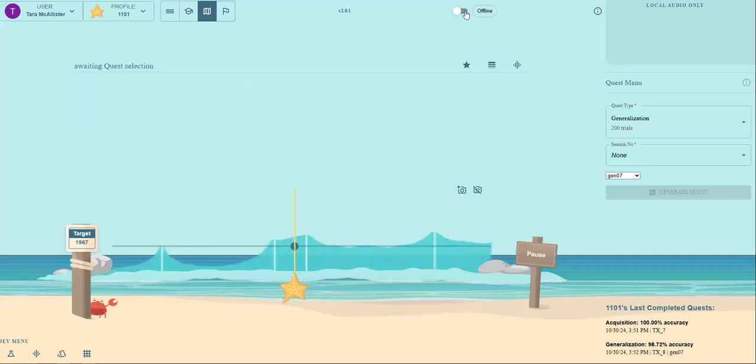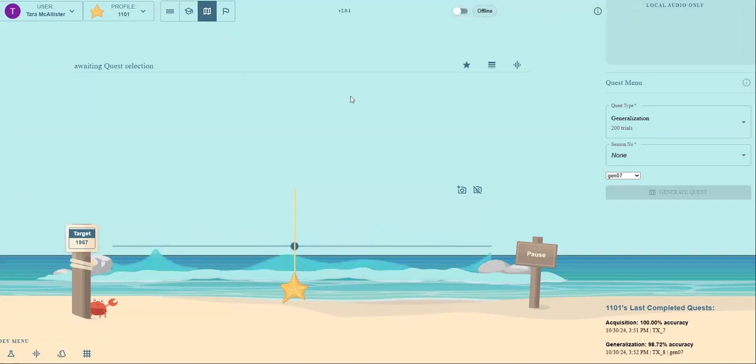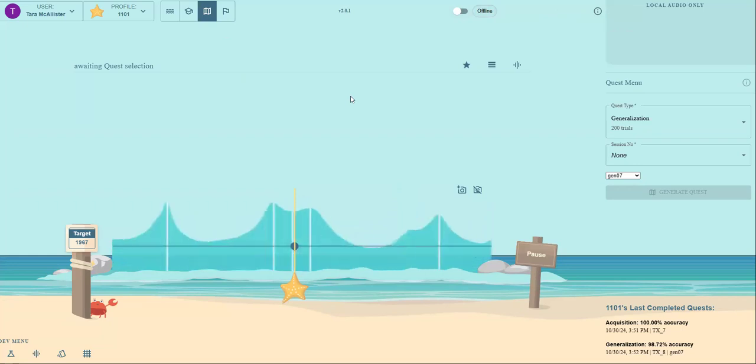One last feature supports remote treatment sessions via telepractice. When I click this toggle, it generates a private room using the Vonage Video API. The client and I can meet in this room where we'll hear each other and see a shared screen view.